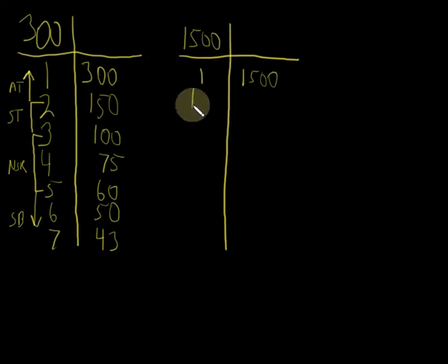But logically, you can do some of these easy math numbers in here. If it was every 10 blocks, you'd have a heart rate that would end up being 150. If it was 20 blocks, for example, you're going to find out that the heart rate would be 75. And you'll see that this stuff kind of lines itself up here a bit. So 1500 divided by 20 comes out to 75. So ultimately, I just determine how many small blocks are there between there, and you can get some really accurate heart rates. You'll get them within a couple of beats per minute of one another, and that becomes quite accurate to read. So that's a great way to do this.